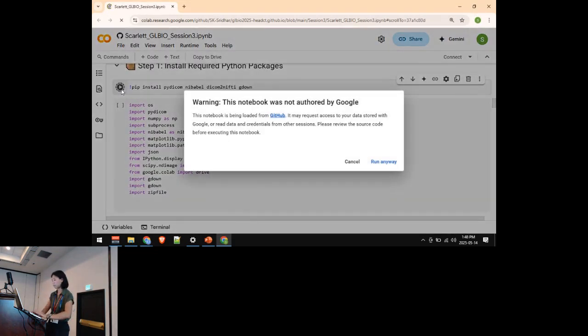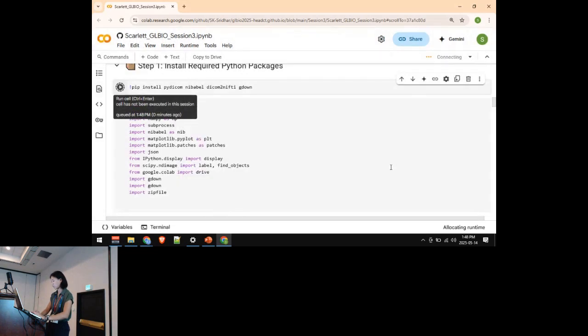Okay, so we have to run the Python packages. It's going to take about 30 seconds for this first part to load.